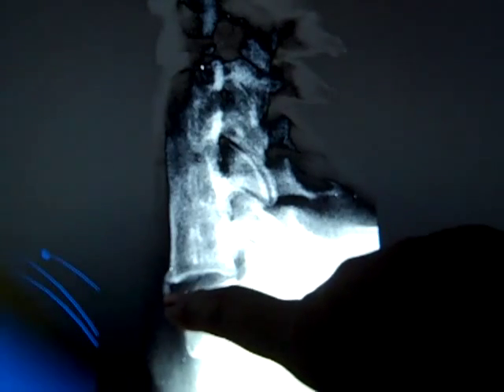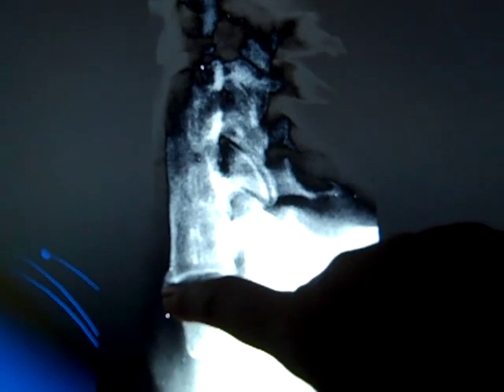If we look at acquired block, this one is acquired block, and it has a wrapping or a plastic sheathing-like material wrapped around, so solid looking. So that one is an acquired block. The thing I want you to notice is you see how there's forming a lipping and spurring at the bottom of this vertebral end plate. There's some problems going on because of that acquired block causing irritation at that joint space.